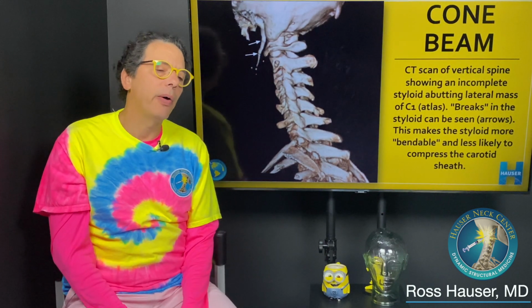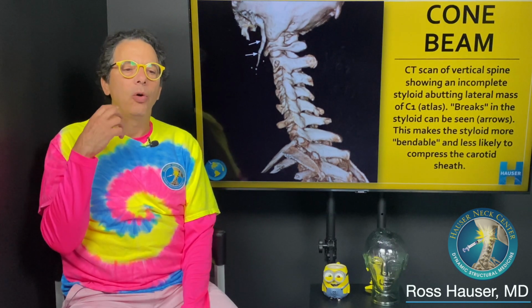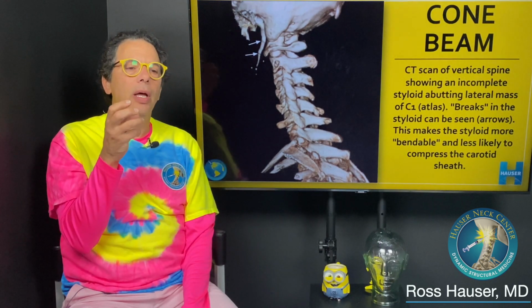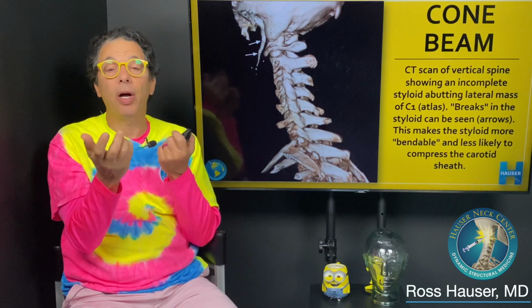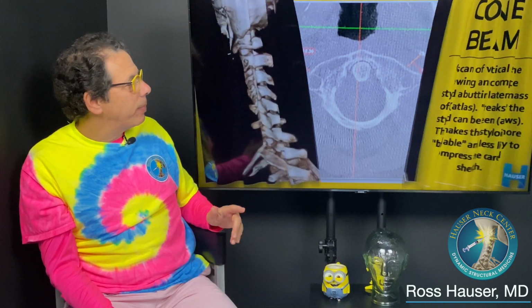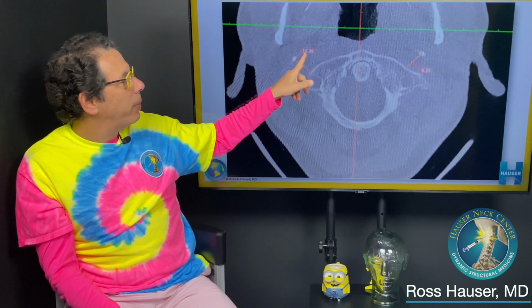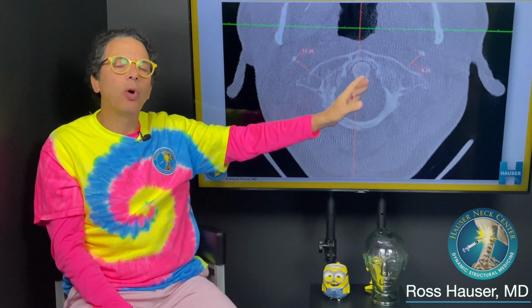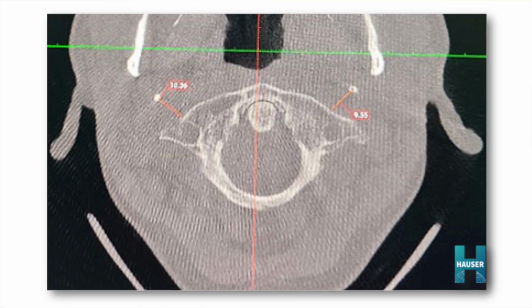So it turns out that people who have incomplete styloids or breaks in their styloid bone, because the bone isn't as strong with breaks in it, it doesn't compress the jugular vein or the carotid sheath as much. So that's important to know as it relates to long-term management. This is what we typically see. In this particular patient, it was 10 millimeters on this side and like 9 millimeters on that side. So that's normally what we see. That means that in general, there's enough space.